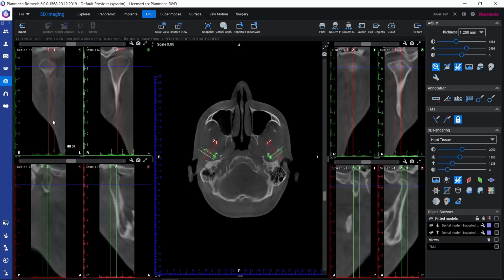So firstly, we can recognize the different views by, for example, hovering our mouse on top of the views. So we see that when we put our mouse on top of a view, the respective line gets highlighted here. And we can also check the color indication. So here we have the green views, and then perpendicular to those we have the red views. And also on these slice views we have naturally the respective lines visible also to mark the position of other views. We could browse through the slices of these views by using the sliders on top of them.